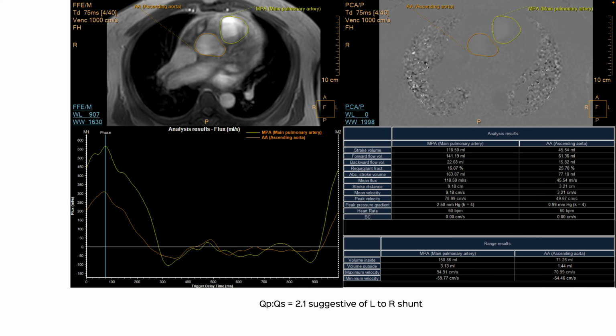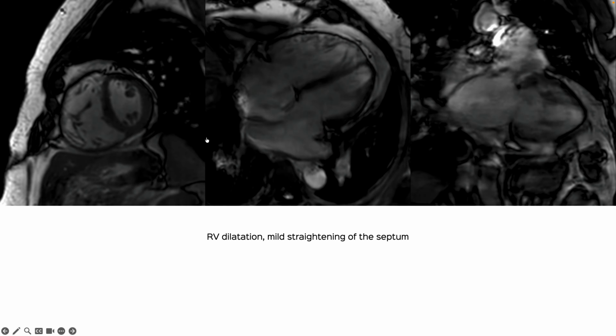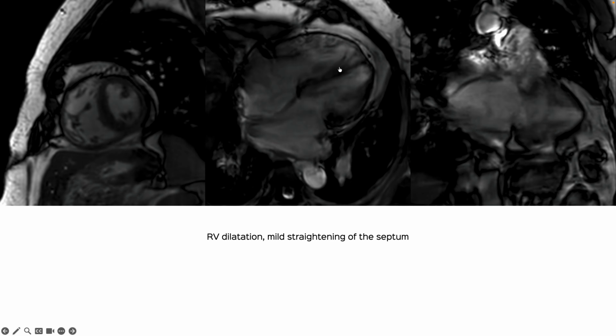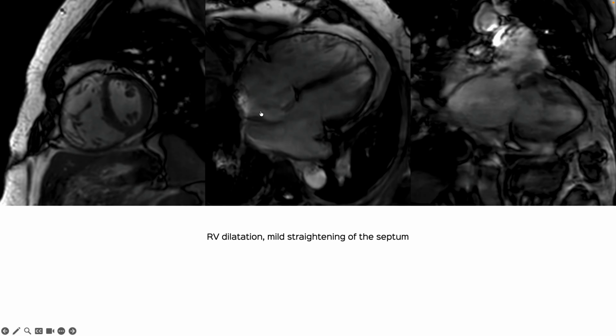The QP:QS was 2.1, so we typically try and look at the absolute stroke volume, which suggests a left to right shunt, confirms that. Then we do the short axis, 4 chamber, 2 chamber, which shows RA RV dilatation, little flattening of the septum, suggesting raised pressures, which is obviously evident.